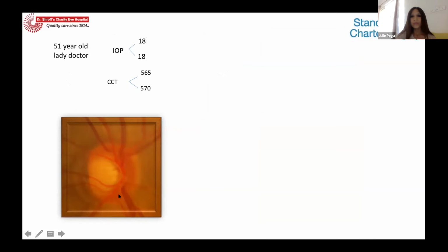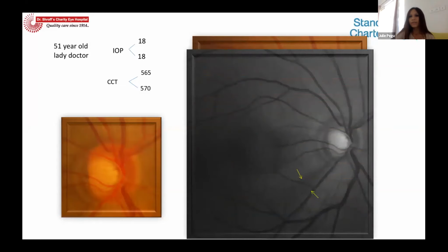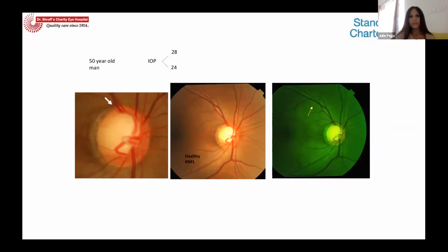optic disc. But when you dilate and see, you can see that there is a nice RNFL defect formed inferiorly, and this is very, very typical of a glaucomatous damage. In this case, the fields were definitely normal, and the OCT was showing some yellow changes inferiorly. But whenever you see a defect like this, at least you are confident that this patient is definitely having early damage, and you can discuss the management protocol with the patient.